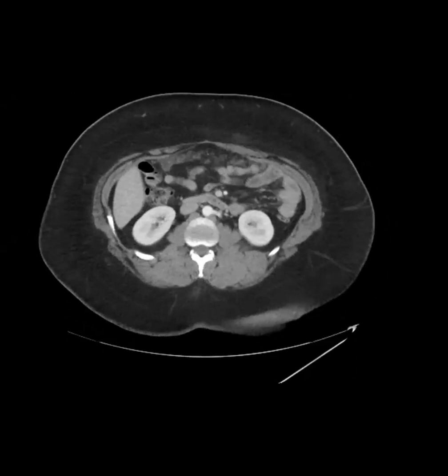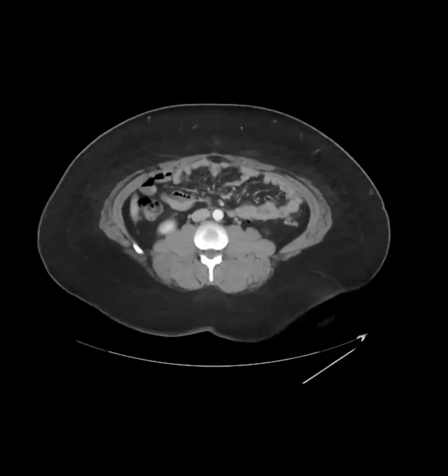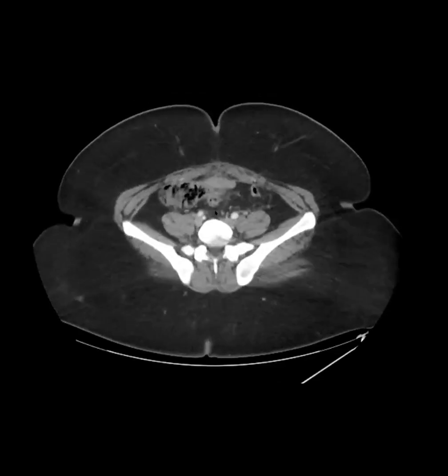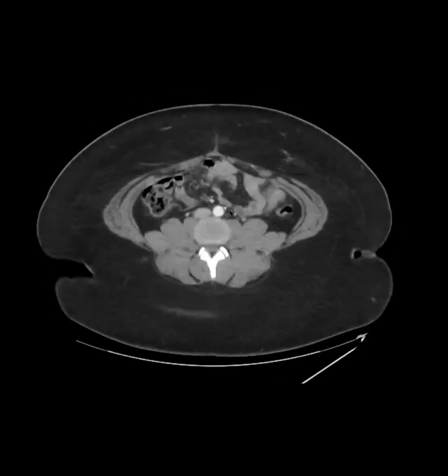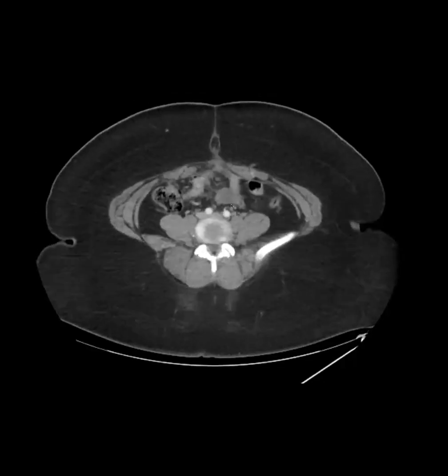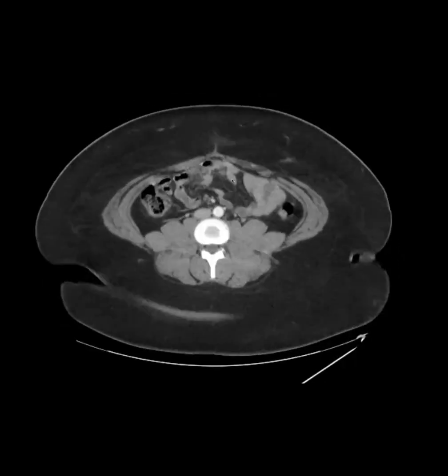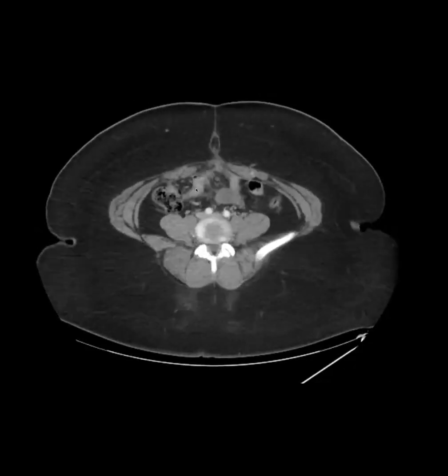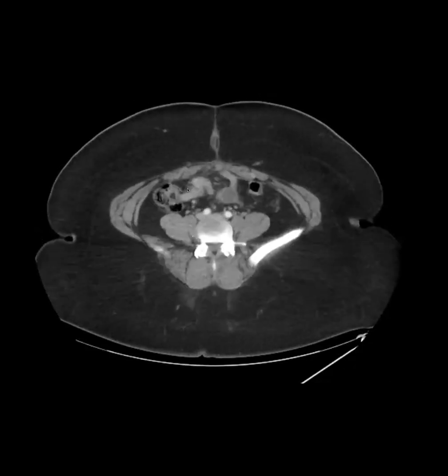So it popped up? What'd you say? It popped? Yeah. Where did the mass go then? Like, where did that big cancer go that was in the appendix? Is it anteriorly somewhere? I don't think so. I was looking at this guy here. Maybe that's part of the mucocele, but it's blending in with these other small bowel loops. And then I think that all of this is the cancer.